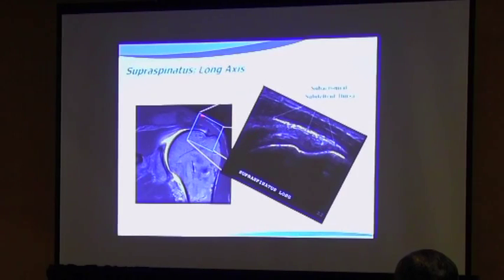And with ultrasound, this blue box corresponds to the area that we're seeing on the sonogram. Overlying subdeltoid bursa. Now here's one where you don't see that little tiny sliver of fluid because you're just seeing those two opposing peribursal fat planes right up against each other.